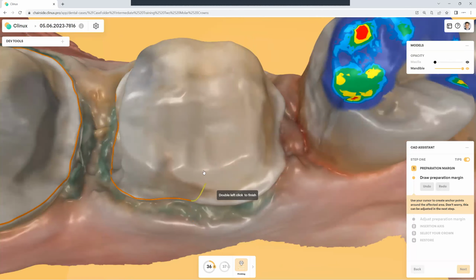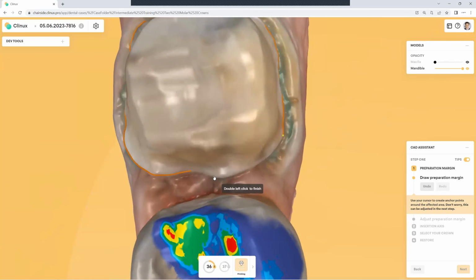And so I like to rotate the model because I want to look at this margin from this view that I have right now, which is more or less of a 45-degree view on the margin. So that they don't go off the margin. See, if you have a perfect up and down view, when you're drawing the margin, it's very easy to go over the margin. I'm just going to show you that here, what that looks like when you go over the margin. You get these little guys down here, okay, where you see the margin drops down like this.